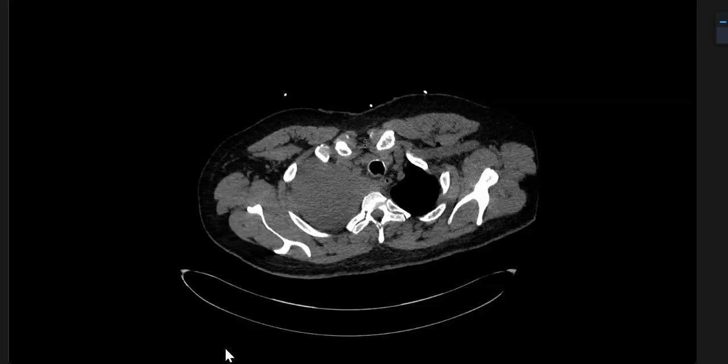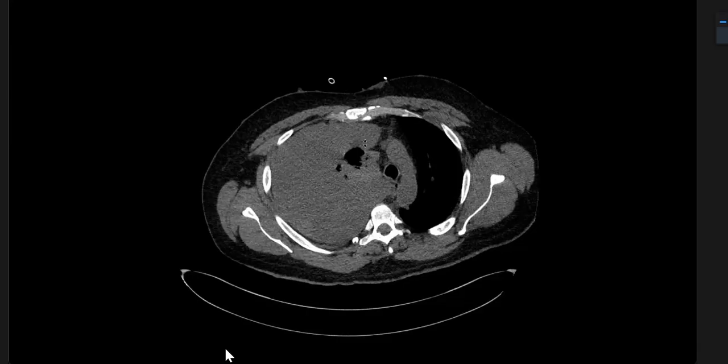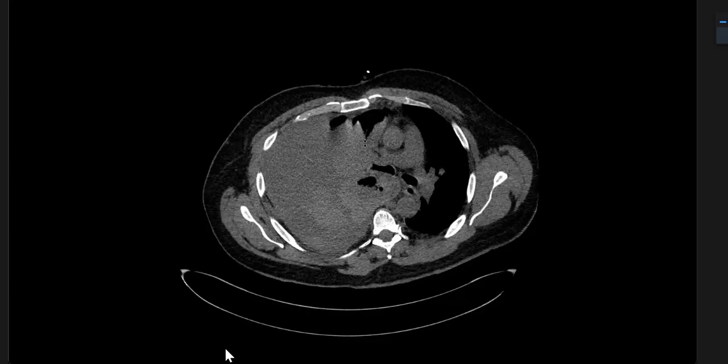And then when you get a CT scan, things become very different here. Okay, first of all, let me share the screen before I forget. So I gave you a non-contrast CT first deliberately to see the thought process. Now, first thing first, you could say it's a non-contrast. Just describe it. It's a non-contrast CT thorax. That's it.